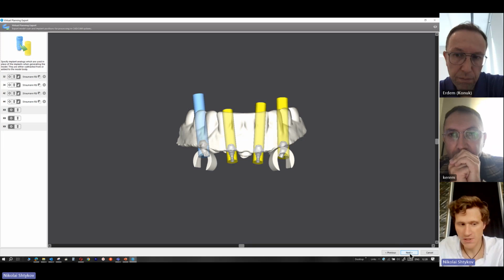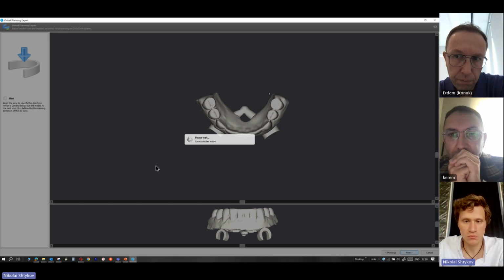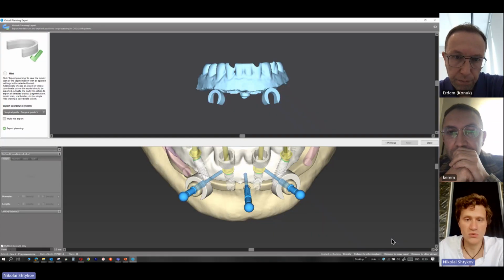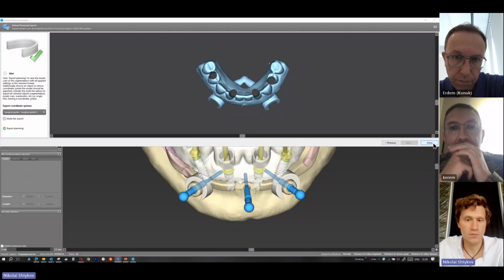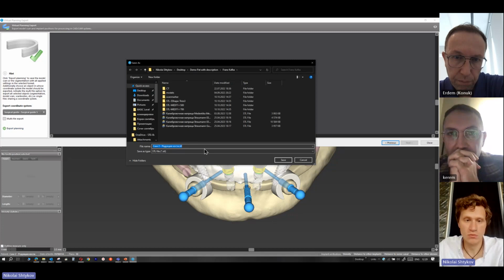Okay, next, and the minimum. This is one of the ways, and here you can see you can export this.